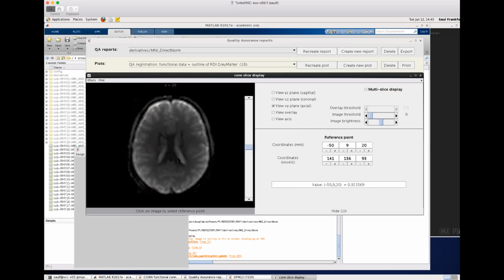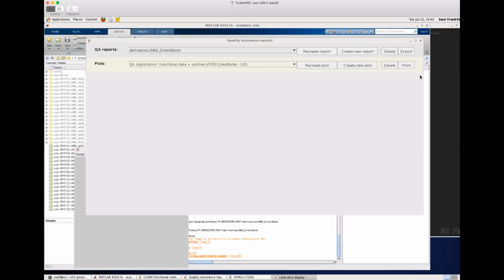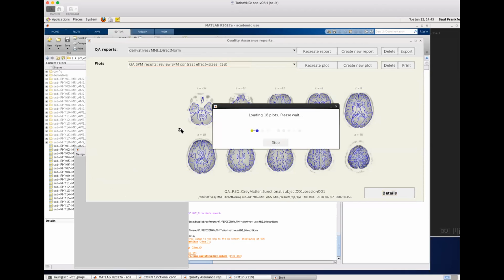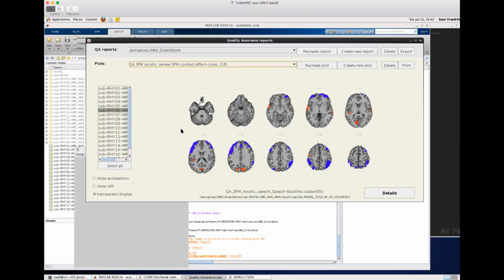So, based on the speech minus baseline plots, coming back to this subject. Contrary to the previous subject, this one is a little bit worrisome, because even though there seems to be a negative association, and we probably don't care that much about negative responses, it's still showing some indications of motion-related activation, and that is worrisome.